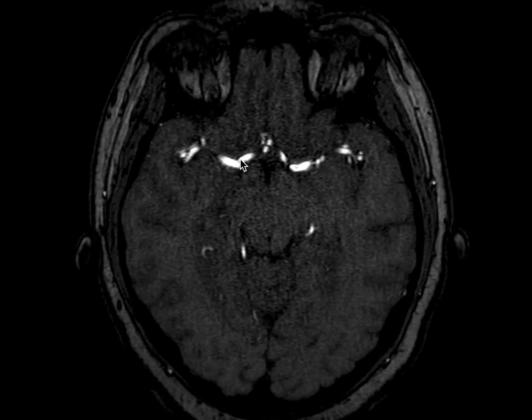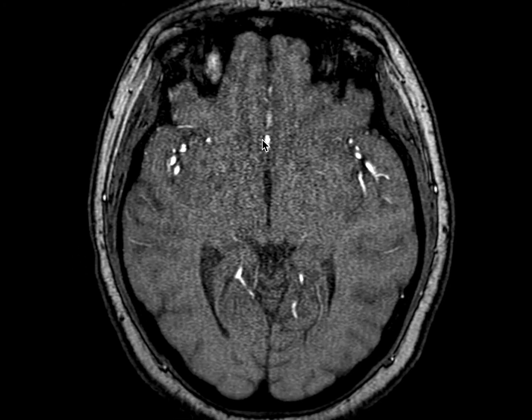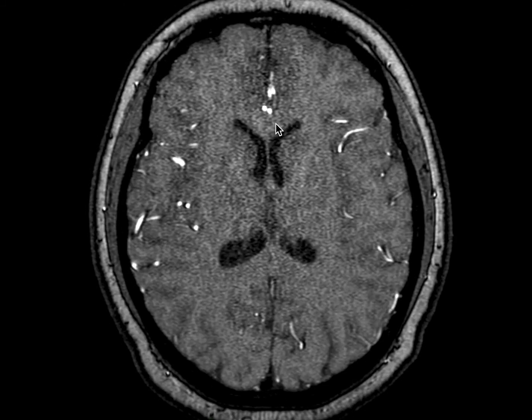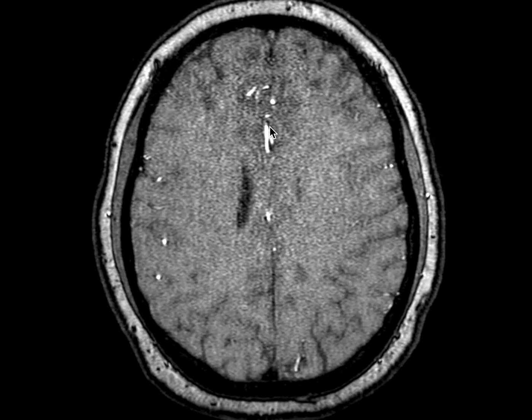Scrolling back down, we'll take a look at the segments of our anterior cerebral artery again. The A1 segment goes right up here, and then arches down slightly to reach the anterior communicating artery seen here. Next, the A2 post-communicating or infracallosal segments will ascend up in the interhemispheric fissure like so. When they reach a point anterior to the genu of the corpus callosum, they become the A3 precallosal segments. When they turn posteriorly, they become the A4 supracallosal segments, and when they get posterior to the coronal suture, they become the A5 postcallosal segments.